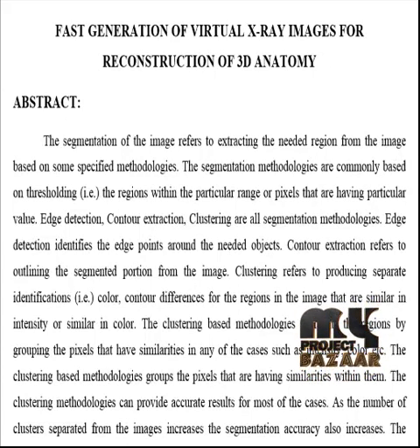Edge detection identifies the edge points around the needed objects. Contour extraction refers to outlining the segmented portion from the image. Clustering refers to the production of separate identifications, that is, color or contour differences, for the regions in the image that are similar in intensity or similar in color.